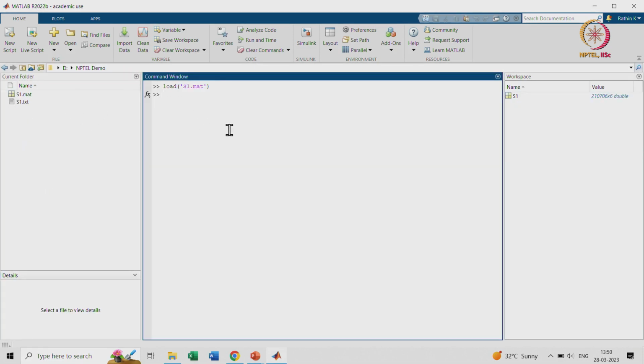Yeah. So now what I will do is open EEGLAB. I will show one approach using the GUI. I will also explain how you can perform batch file processing. In both cases you can do pre-processing, feature extraction, classification, and an ERP extraction based pipeline, everything. Whatever you can do in the GUI, the same thing can be converted into code, and then you can provide for batch file processing.